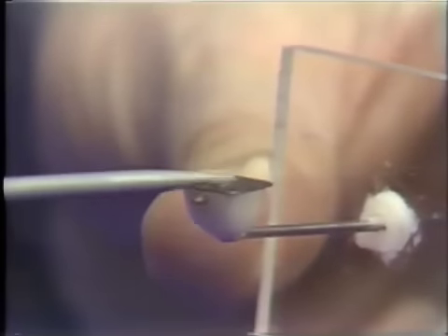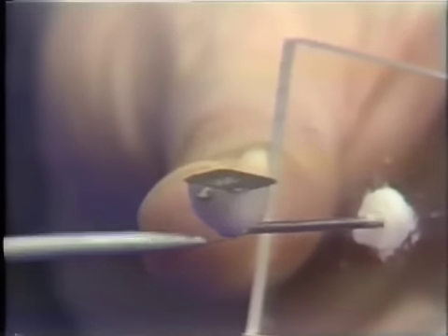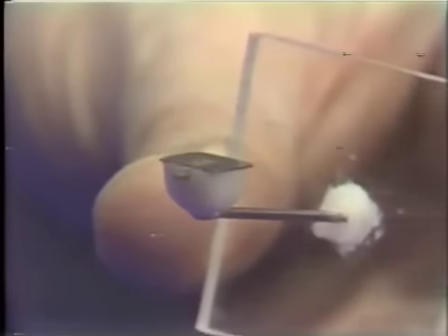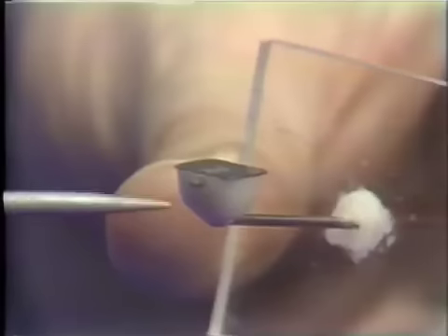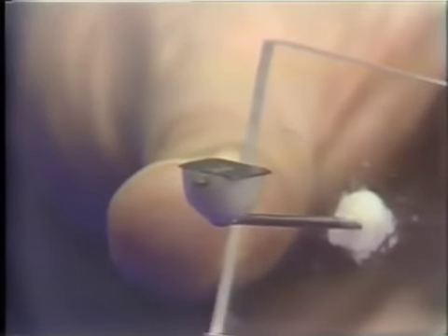The precious metal table here is used to wax up the occlusal surface on this. So the Pontic consists of two parts, really. The gold occlusal surface here, which takes the main stress, and then an undersurface of porcelain against the mucosal tissue. Not used too much these days, but one should be aware of its existence. Occasionally comes in as a clinical case with the porcelain broken. And of course, as with all the Steele's types of Pontics, you select another base for it here, grind it to shape, and slide it on and cement it in position in the mouth without taking the Pontic out of position.